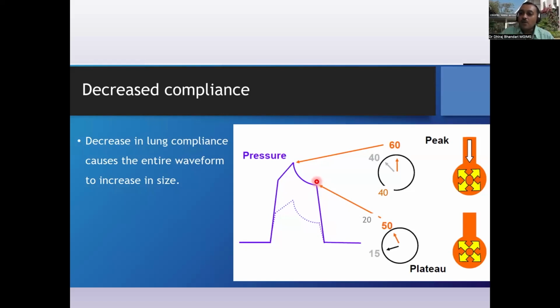that is the compliance. Now when we talk about the ARDS ventilation strategy, we say that we will allow a plateau pressure of around 30 centimeters, in obese patients 35 centimeters. People casually tend to say that we'll allow pressures of 30 and 35. Those pressures actually imply a plateau pressure and not an airway pressure. So this is something we need to be very clear about.